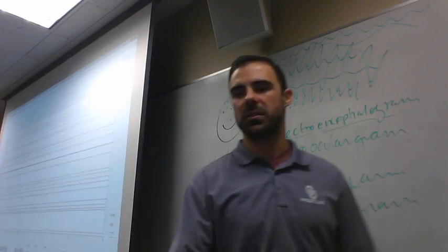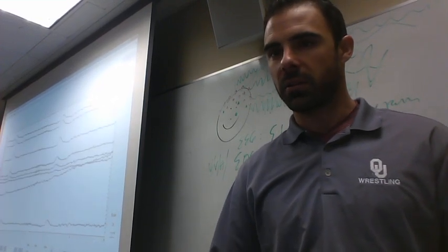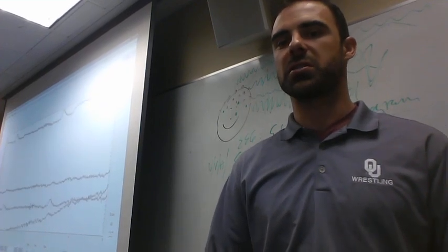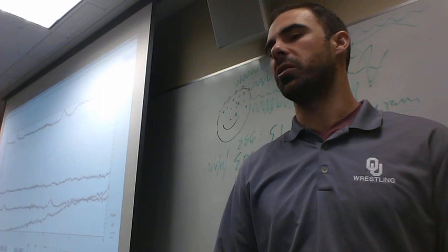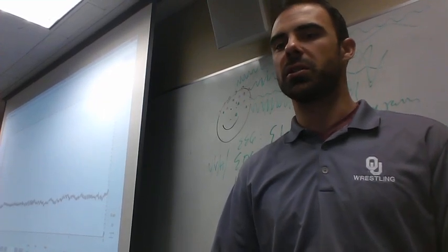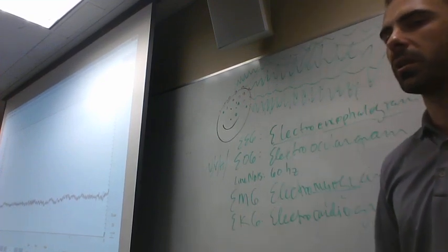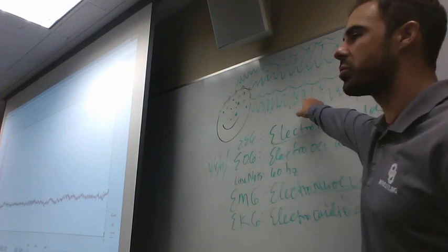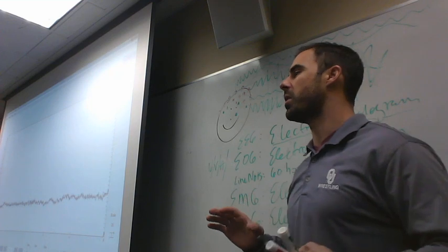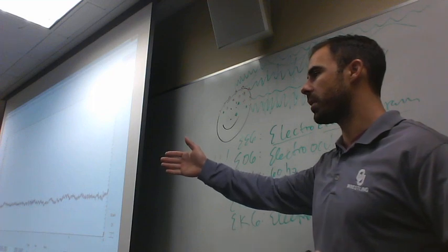Okay, so if we go back to, let's say, 75, okay, I'll bring it down to 40 if you want. You can see this looks like what we would expect our EEG to look like, right, when we zoom in a lot closer. So here we have a singular trace from a singular electrode. And it looks just like I said, we have one trace, but that trace represents the amalgamation or combination of all these different factors. Does that help to clarify?